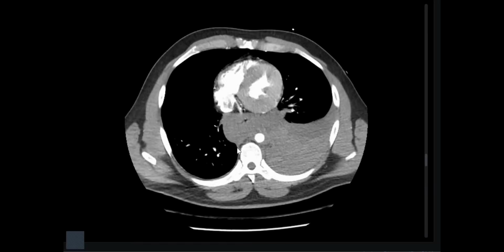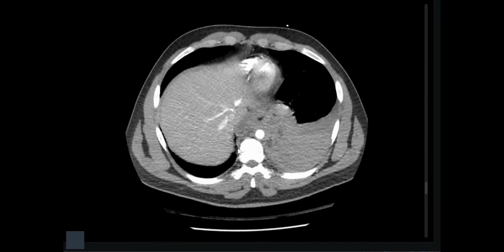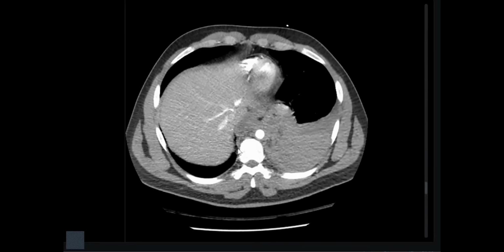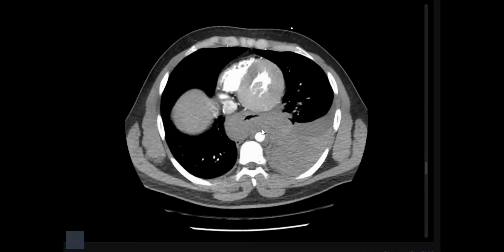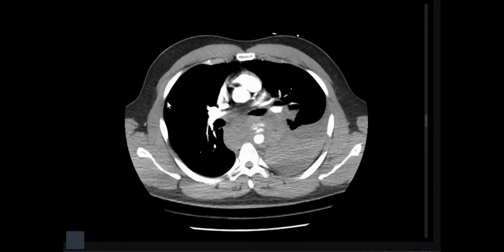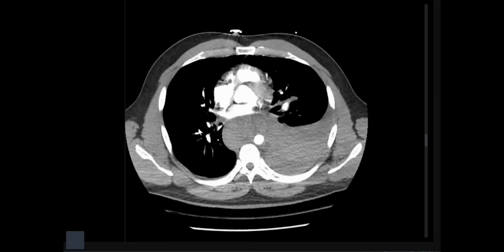What is the need for the abdomen here? I have to look for any abdominal collection, pneumoperitoneum, and hemoperitoneum also to be ruled out with the history of trauma. Is it optimum to assess the abdomen in arterial phase? No, sir, venous phase. As there is active bleeding within the thorax, to see for IVC collapse, any signs of shock, to rule out hypovolemic shock syndrome and any associated injuries. Excellent, my friend. Very good.